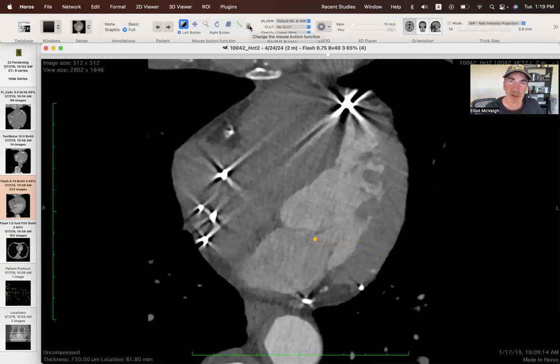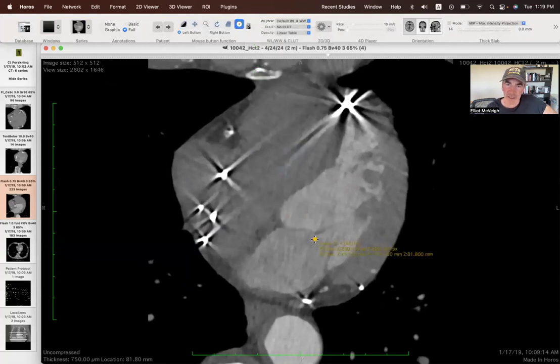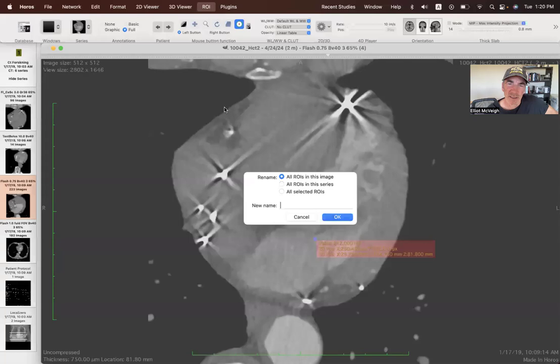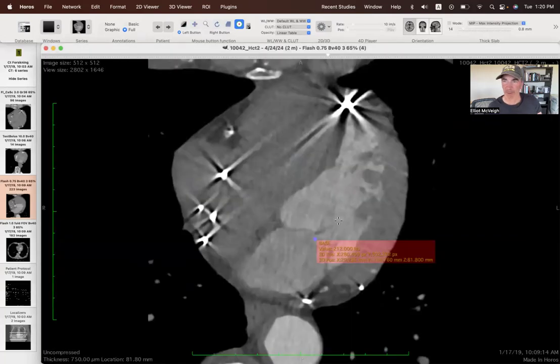And I'm going to turn on again the point, right? And I'll select that point. It just highlights it. I didn't put a new point there. It just highlights that point. I'm going to rename that point, and I'm going to name it BASE, all caps, base. It's important that these words are the same every time, because I search for them later in the software.